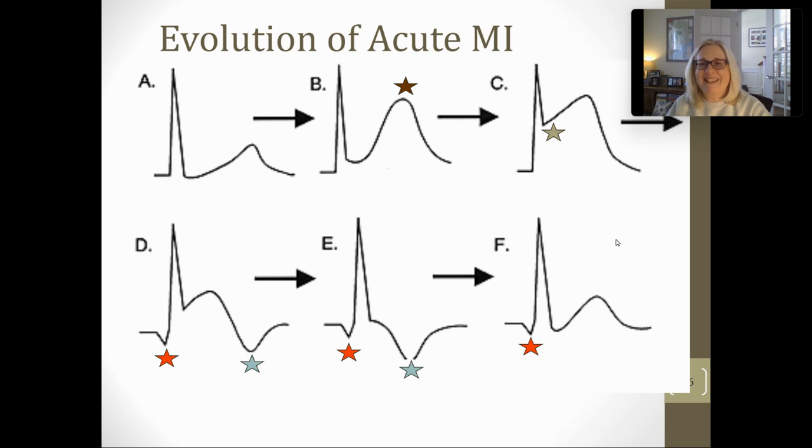There's one more piece to this that I did not show you before, so it's kind of just a review. A is supposed to be a regular EKG, okay? B, the star, so star yours on B. A, I would put regular or normal EKG. For B, put a star at the top of that really tall T. That is a peaked T, hyperacute peaked T.